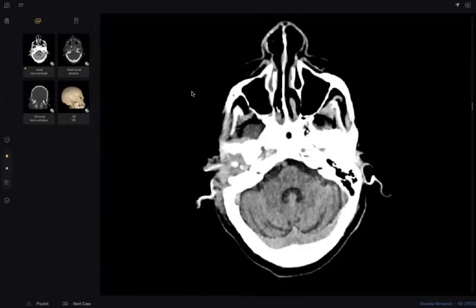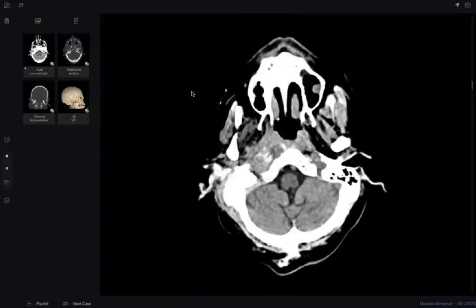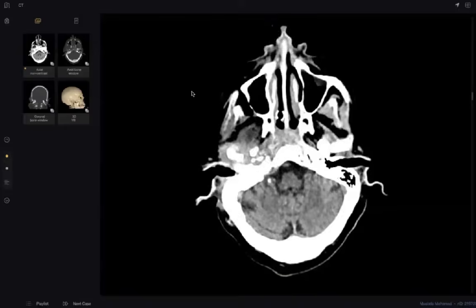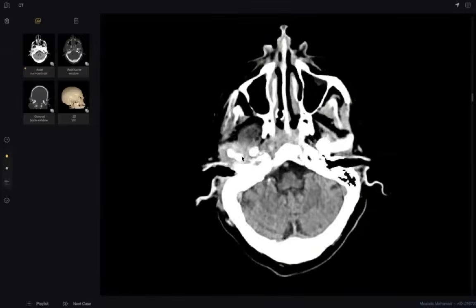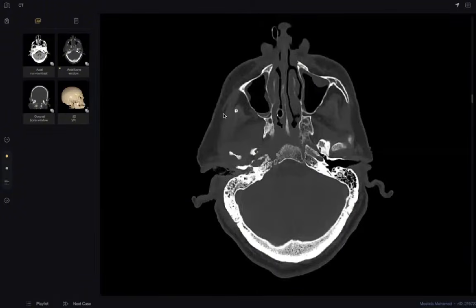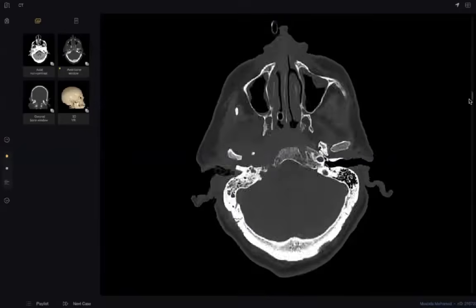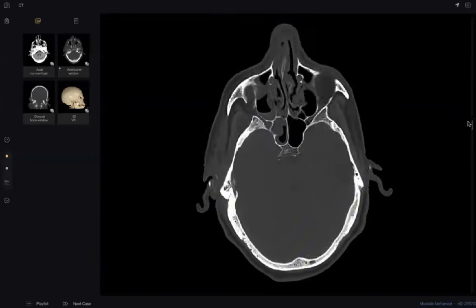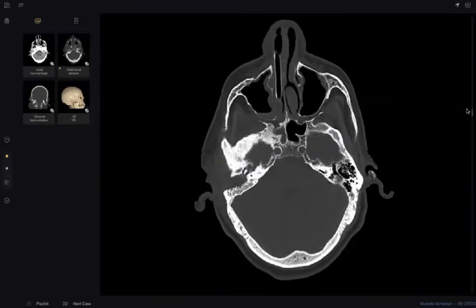After the surgery, look, aggressive, severe right-sided soft tissue infiltrating the area of the right ear and petrous bone. You did very well when you asked for the bone window and started describing the skull base and petrous bone, which is a non-familiar area for all of us.